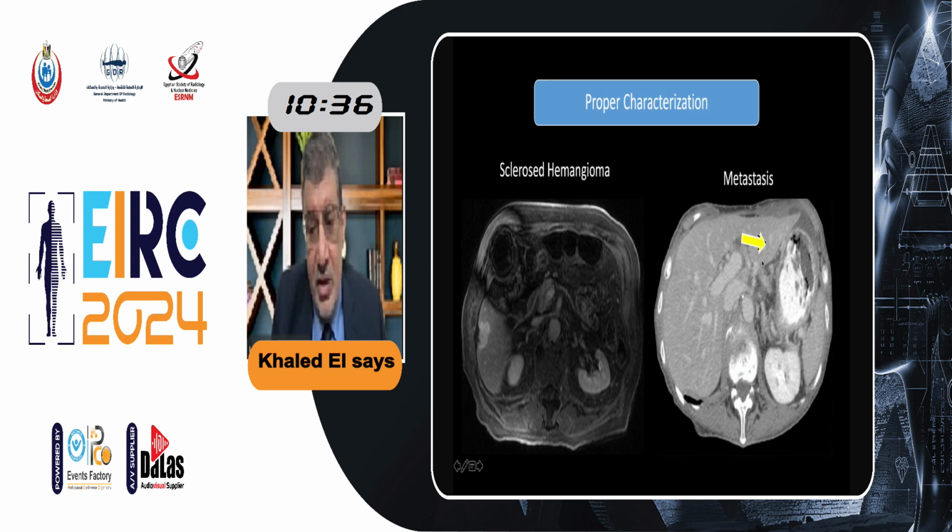Metastatic deposit does not demonstrate blood pool enhancement. So it fills in because of its abundant interstitial space. That happens with the fibrotic tumors, such as metastatic deposits. Okay, they accumulate contrast and they can lead to this enhancement in the delayed phase.